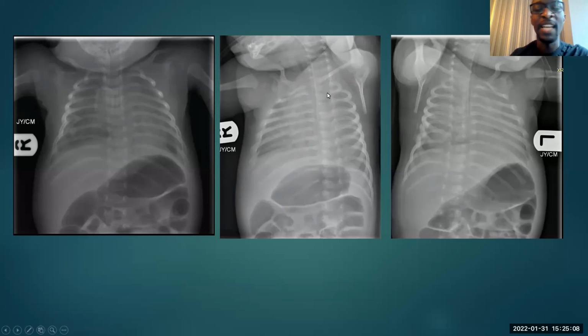And actually, if you're talking about putting a child into social services care or not, that tiny 0.0000 of a millisievert, we'd rather have the information. So what we now do is open the collimations so that, yes, I'm more interested on this side with this particular view, but let me have this information for free as well, because it's all useful.